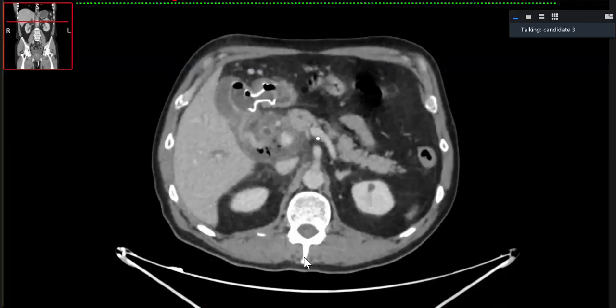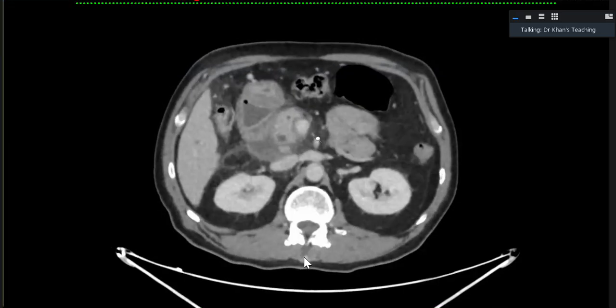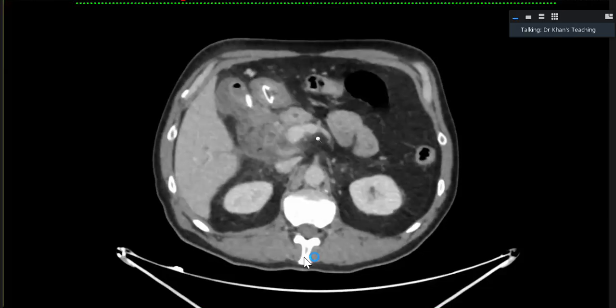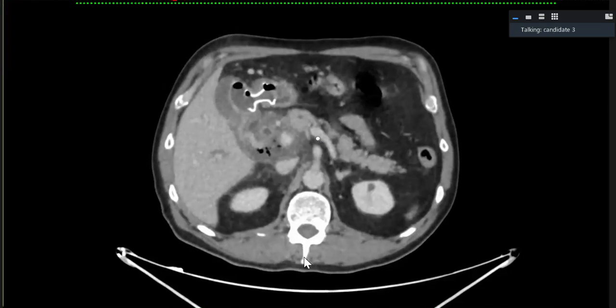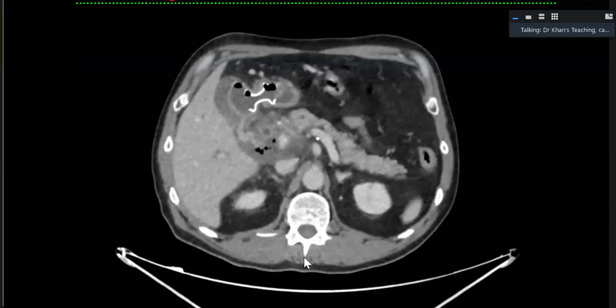Why will they drain the gallbladder like this? Otherwise, this metallic density is not typical for being a biliary stent. Its shape is not ideal for that. Gallbladder communication could be made in case of obstructive jaundice if it was markedly distended. One possibility is that we do open cholecystostomy, or there might be some internal drainage procedure done, or there was some pre-existing fistula there.